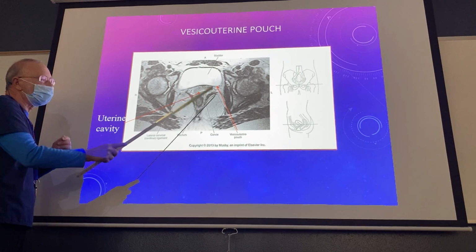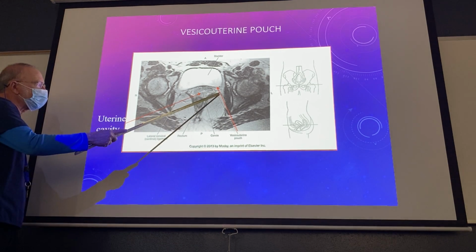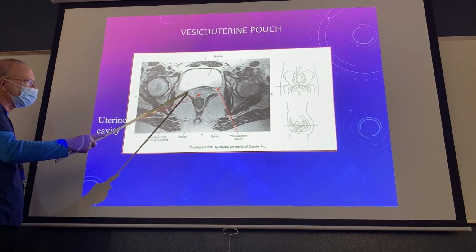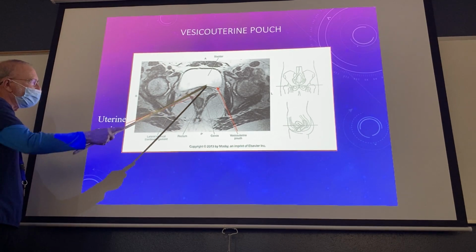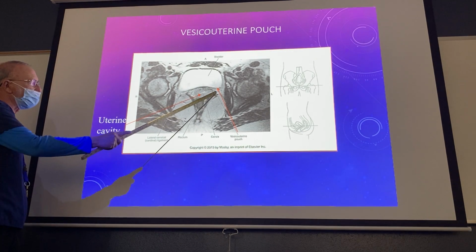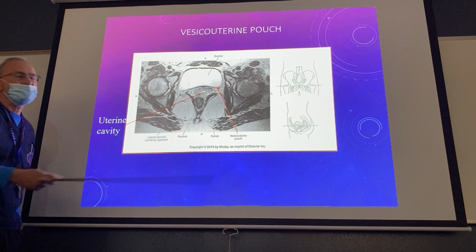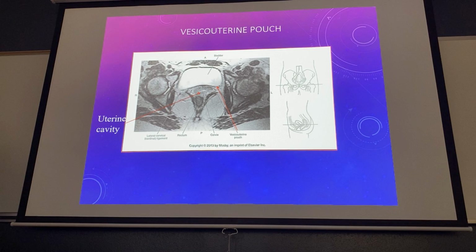But why this is really important, individuals as they get older oftentimes will have prolapse of different structures, whether it's uterus or bladder, even rectum. What holds things in check is this little V-shaped muscle right through here called the levator ani. And basically it holds everything up in terms of its normal position in the pelvis. So oftentimes when we're doing imaging, especially as a person gets older, we get worried about prolapse. And that will be an important structure to evaluate to see if there's any signs of weakening of it from that standpoint.